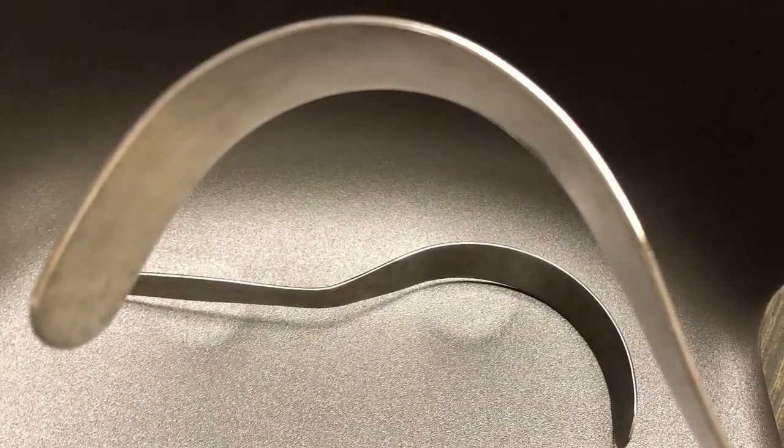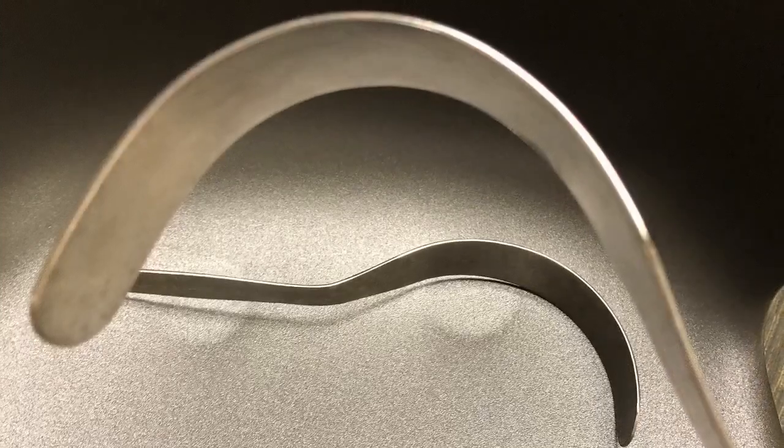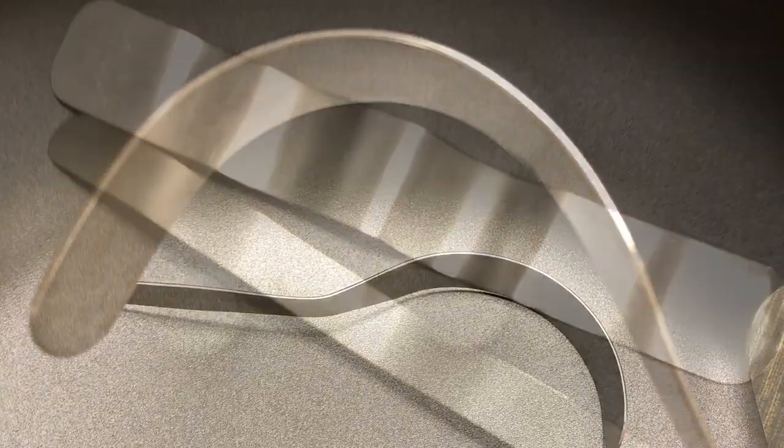The Deaver retractor. This comes in varied widths. This is a handheld retractor. It is curved to retract around organs. Always remember to pad around retractors with wet lap sponges below the retractor to protect against organ or tissue injury.